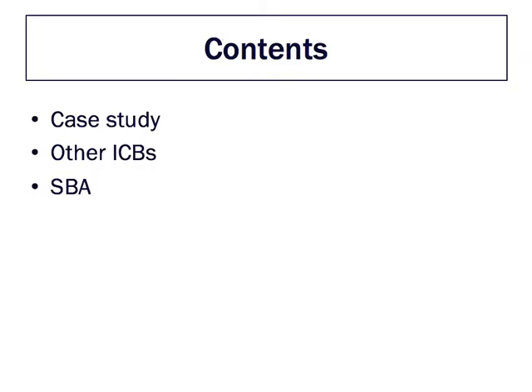So we'll start off by going through a case study, then we'll go through the other most common types of intracranial bleeds and have a look at some of the imaging for those, and then we'll finish with a quick quiz question at the end.